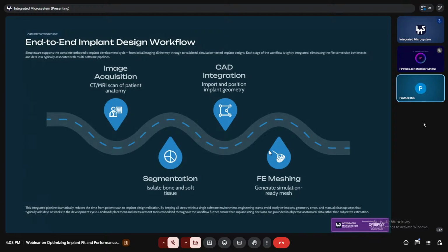After image acquisition, we can go directly to the pre-processing of images, like marking our region of interest, going for the cropping tool, and there are resample tools, rescaling tools available. So we can directly pre-process our data, and if we don't want any specific part of our 3D rendering, we can directly cut that portion out and select our region of interest.